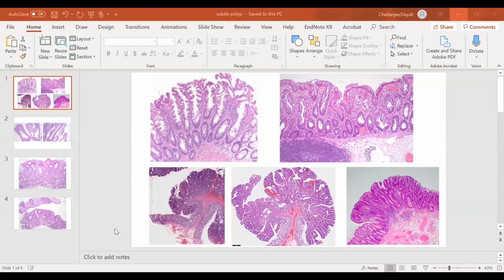Yeah. Okay, I just wanted to start with an overview of the basic polyps that we see so that it's easier to explain the histologic findings in this particular polyp. So the top portion shows basically a lot of serration in the glands. So these are serrated polyps. When the serrations are more in the superficial area, but the glands in the deeper part, which touches the muscularis mucosae, look normal, that's what we call hyperplastic polyp.